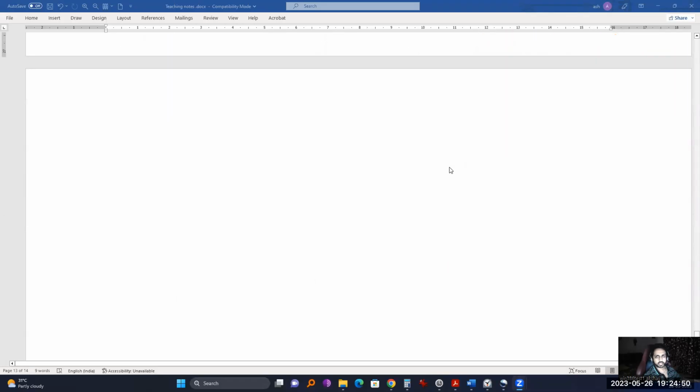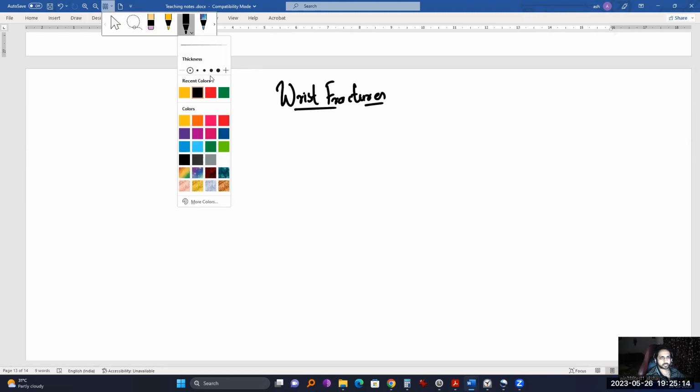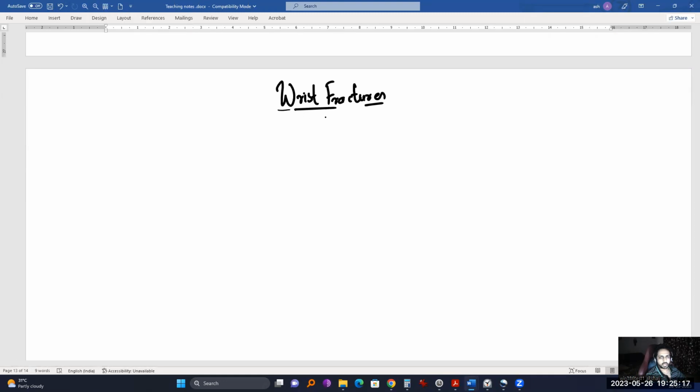Okay, now next let's see some common distal radius fractures or wrist fractures. There are three main fractures that you need to remember.